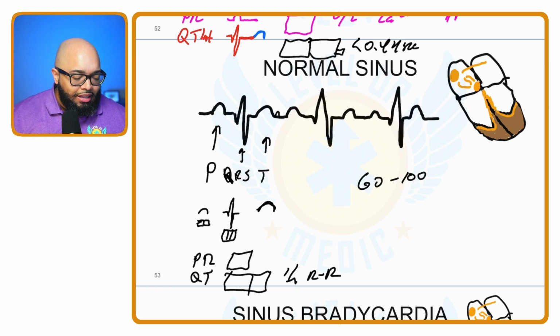Okay. Now, obviously, if we're talking about the ST segment, we're going to look for elevation versus depression in the ST segment. So what I'm saying is just by knowing normal, we can quickly figure out abnormal. However, if you don't really understand normal well, you're not going to find a lot of these things. Remember, you don't find what you're not looking for in the EKG.